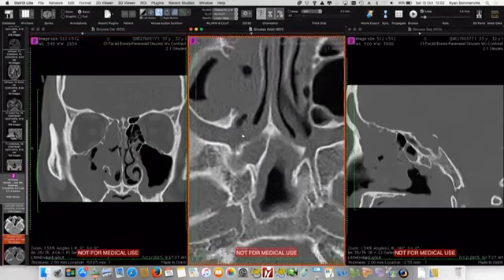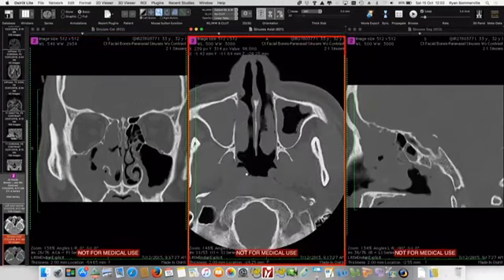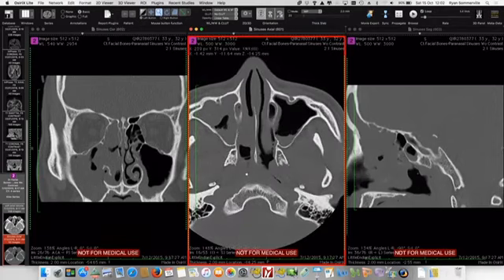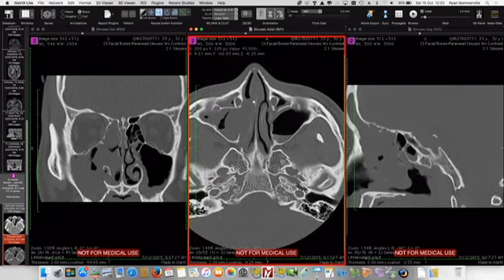And then on the axial imaging as well, you can see the inferior meatal antrostomy coming up to the inferior turbinate, and then above it, the normal maxillary sinus ostium, which has been greatly widened, and a big expanding polyp pushing the middle turbinate immediately there.